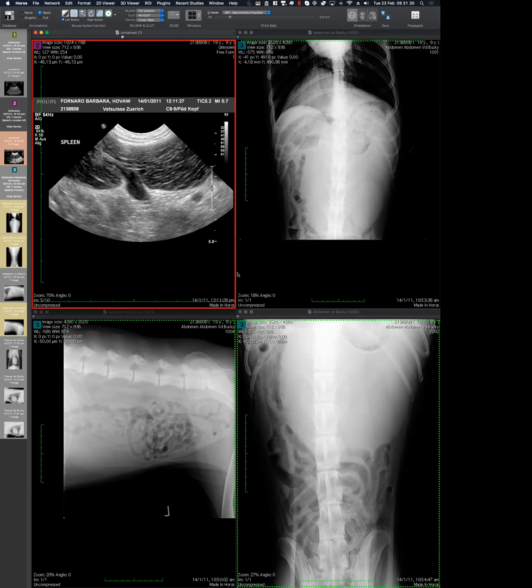And probably, and I wasn't intentional, but this is one example why ultrasound may be useful in a situation like this, because it's basically telling you a completely different story. In a sense, this is a torsion. I think with ultrasound we can be pretty sure. So making a call about going into surgery or not, in this case, is different again compared to having a mass where it could be from benign to malignant.